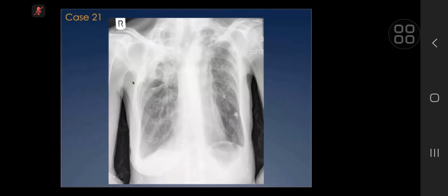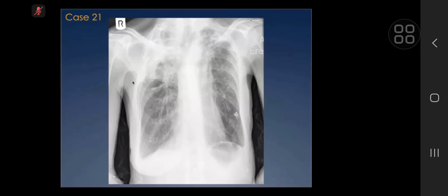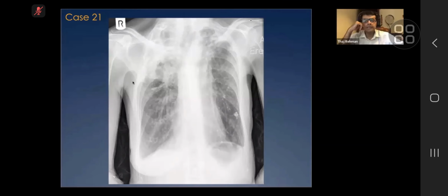Sometimes radiation can cause it as well, but this is not very typical radiation. Bilaterally? No, mostly it's going to be unilateral. So for bilateral apical fibrosis, we discussed the differentials earlier. It can be TB, ankylosing spondylitis, CWP, progressive massive fibrosis, and so on. In this case, you correctly identified an abnormal density in the right apex. What do you think is happening here? What might have happened?